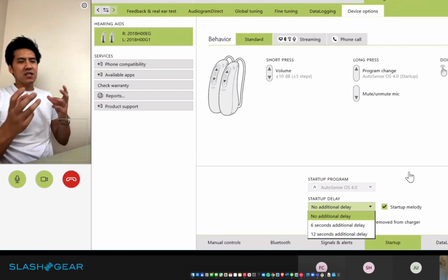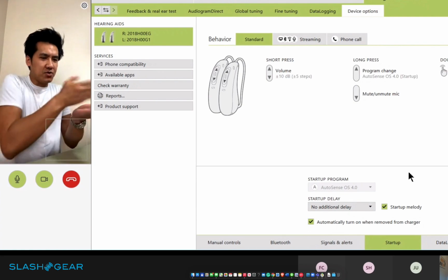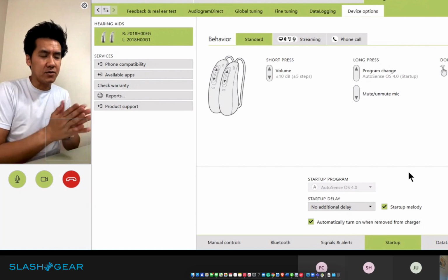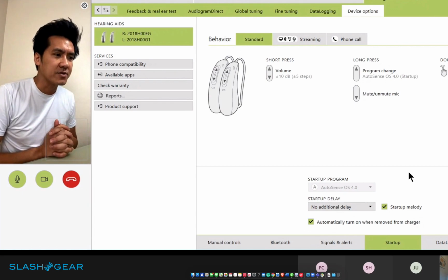Just the level of detail and thinking that has gone into the process. For me to be able to see this and to relay this to our readers is just fantastic. This is really good. Very granular. Yeah. I would like to show you 2 more features. Sure. If that's okay for you?